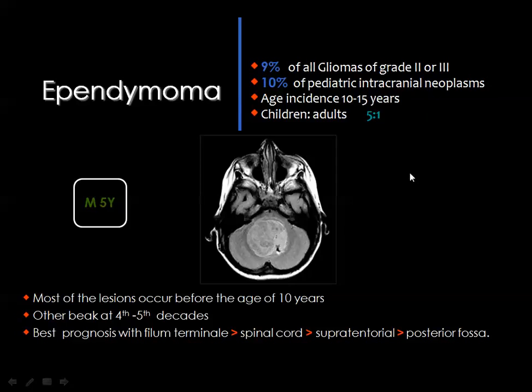This tumor is located in the region of the fourth ventricle, and commonly you will see a mass in the midline posterior fossa region centered on the fourth ventricle. This mass will show the criteria of the tumor being an enhancing lesion, and it may contain calcium, and it may show some vessels within the tumor.